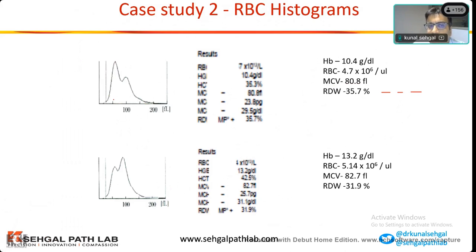So here I can tell you without the slide, this is a combination of microcytic and normal cells. So what is the cause of this dual peak in this patient? Dr. Akash, I'm coming back to you. Hemoglobin 10.4, two populations. How can a person get two RBC populations in the blood? Dr. Kezia? Sir, one, post transfusion, or it might be iron deficiency anemia on treatment, sir.